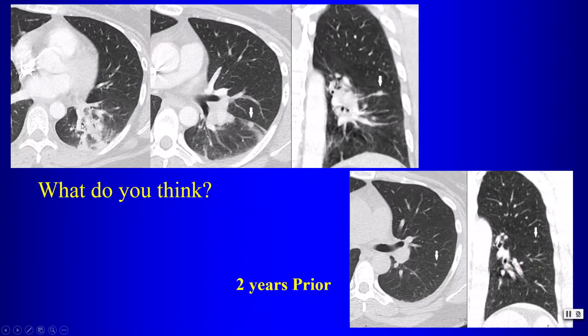Well, hopefully you also notice that this patient has some consolidation here in the left lower lobe. So this patient has a pneumonia, and this could represent an intrapulmonary lymph node, this benign appearing perifissural nodule, and these can enlarge, especially in inflammatory states like with pneumonia. So in a case like this, you would recommend a follow-up CT when the pneumonia has subsided to see if this nodule gets smaller or if it gets larger.